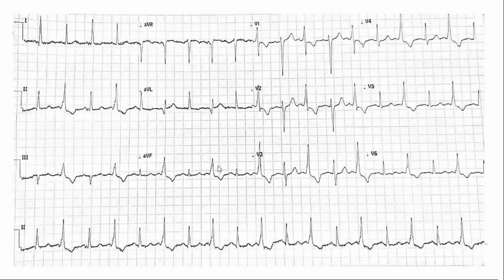So this was not a PVC. This was a perfectly timed pathway conduction after one beat. This is a very interesting slide, usually not seen, but I've seen this patient as well. So just remember your basics. Don't just jump to the diagnosis. Always measure your intervals. Look for everything on the ECG. I hope everyone agrees with this. Okay, let me show you the next slide.